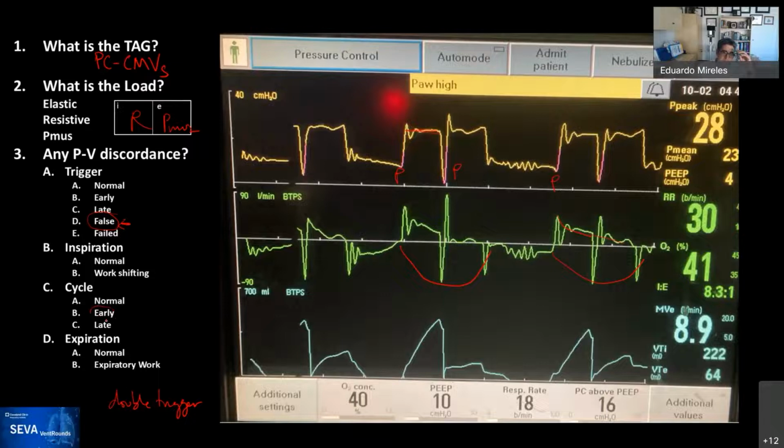That's happening, or that this is an early cycle. Either or is the situation. So I'll ask Rob, what does he think, and where are we going here? I think I have to agree that this is a false trigger. I think you got the same noise spike on the expiratory side as you have on the inspiratory side. Exactly. So the same height, right?